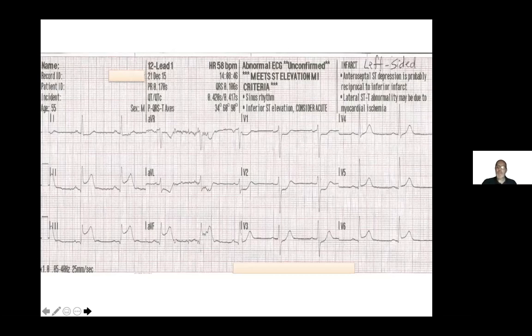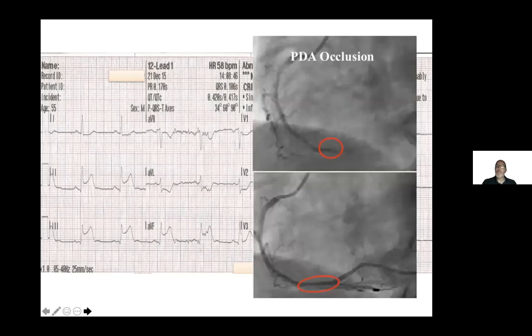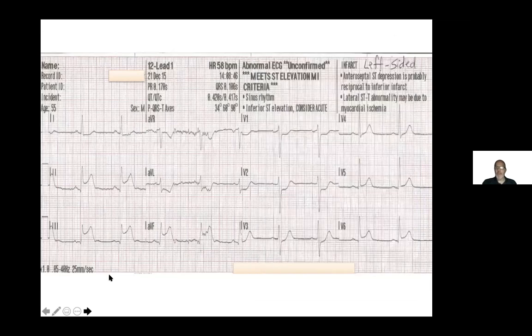But nonetheless, this is also a right coronary occlusion, but in this particular patient, it's the posterior descending artery. Remember, 85 to 90% of us are right side dominant. So this was a right coronary occlusion, but it was further down and it took out the posterior descending artery. So if I remove this for just a second, you notice up here, it says this was the left-sided ECG. I apologize profusely. I don't have the 15 lead.